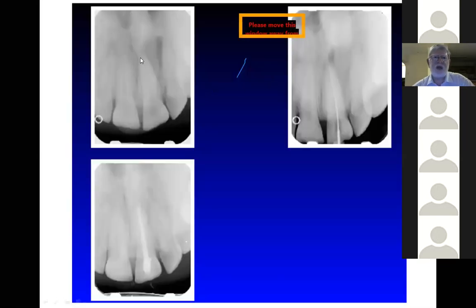And earlier, we had that patient who had multiple large abscesses, granuloma, cyst, and I said, occasionally you'll come across an extremely large lesion. This was an incidental finding. The patient had no symptoms whatsoever. So sometimes that's how chronic things can be, and the patients aren't feeling anything. And this is around the time that we were cleaning everything out. And this is a few years later where things have healed completely there.